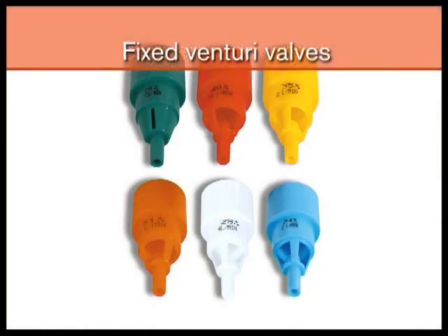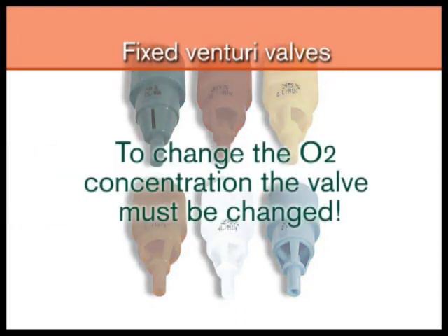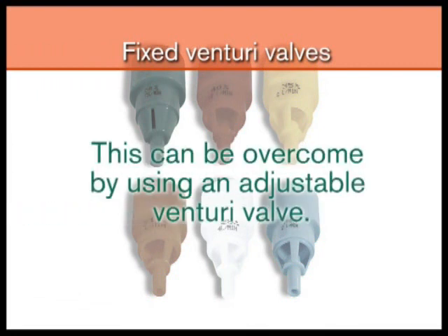A disadvantage of fixed concentration Venturi valves is that in order to change the concentration delivered to the patient, it is necessary to change the valve. This can be overcome by using an adjustable Venturi valve.